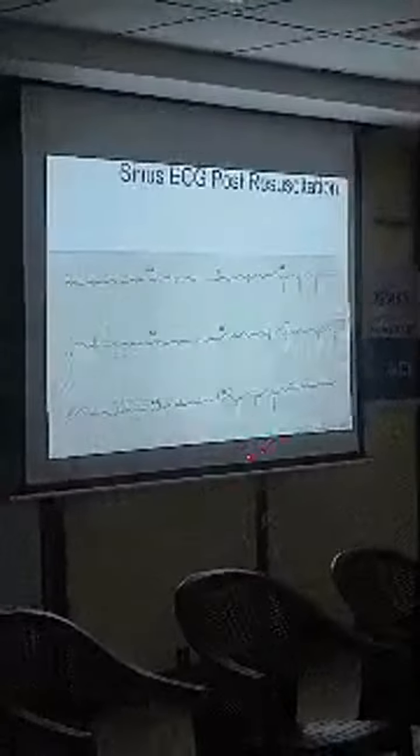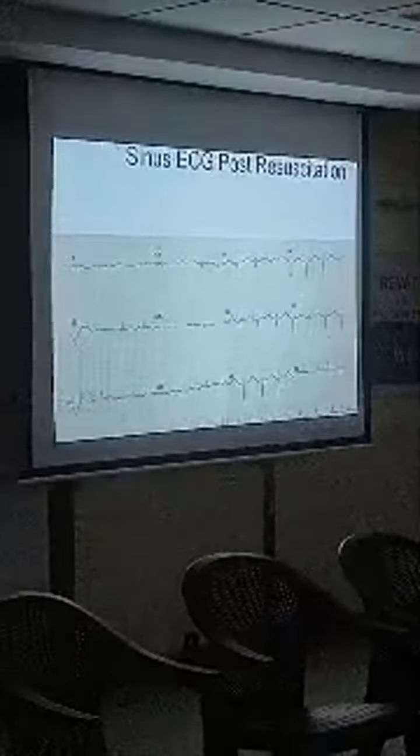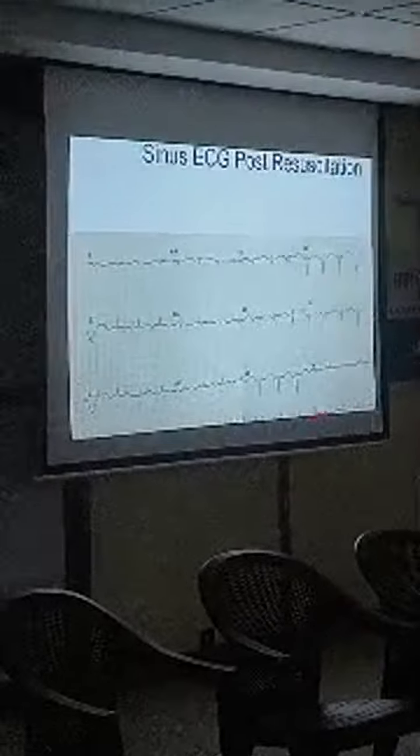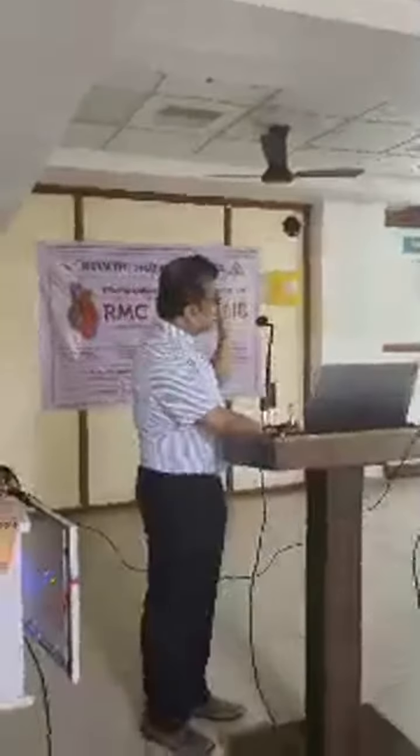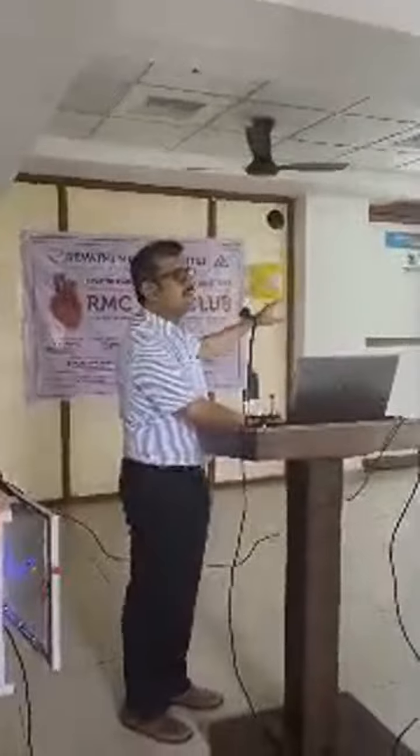Whenever you see an ECG, this ECG does not have any measurements. Most of the time your ECG would have said QT is prolonged. Most of the computerized ECGs would have clearly shown that QT is prolonged. Our QTc interval would have been in the range of 700 milliseconds.